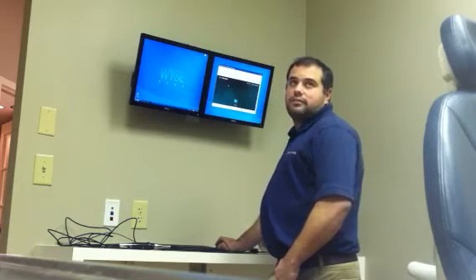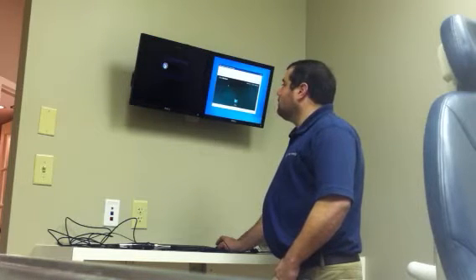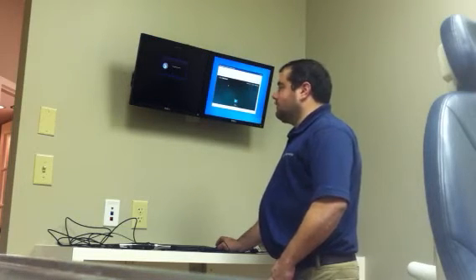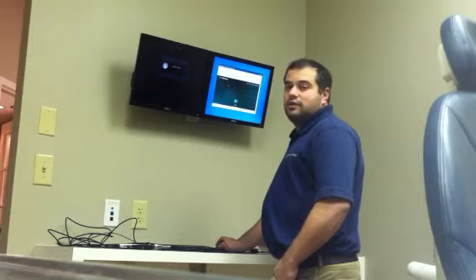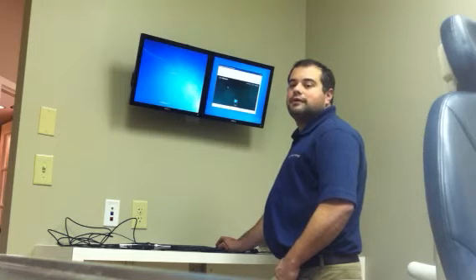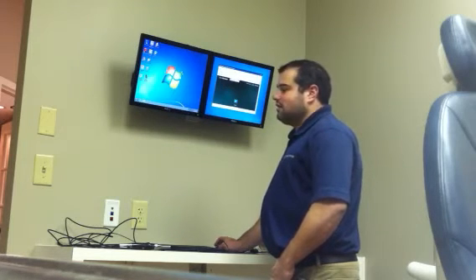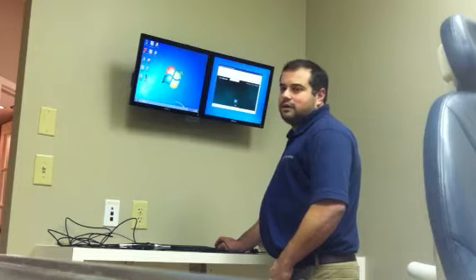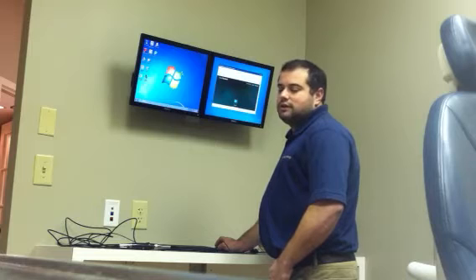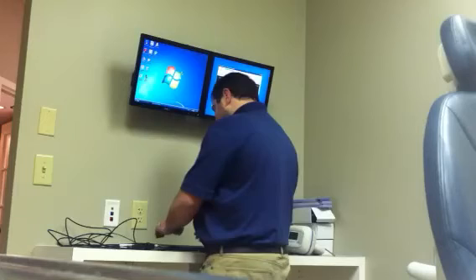Now, I don't recommend this, but just for the purposes of demonstration, to see that we can do it, we're actually going to open our Citrix components on one monitor, and we will run some Hulu video on the second display to simulate patient entertainment or patient education. Keep in mind that all of that second display is still right now being handled by the thin client. There's not a lot of CPU left over for it, but it does work.